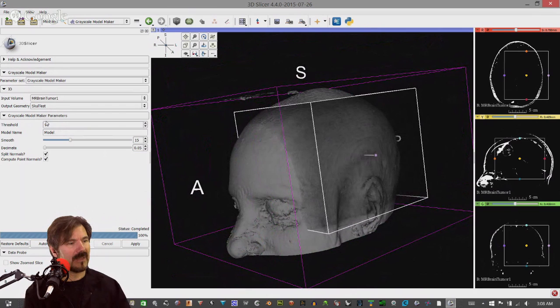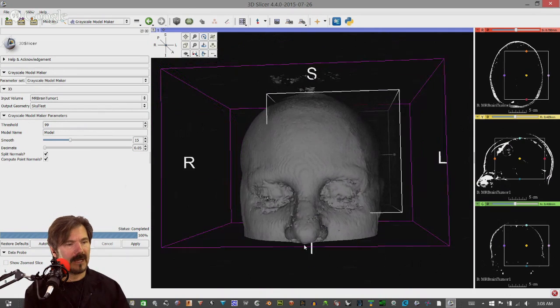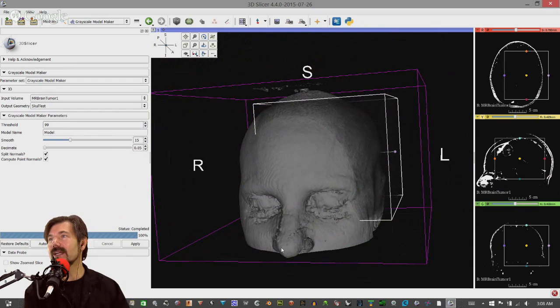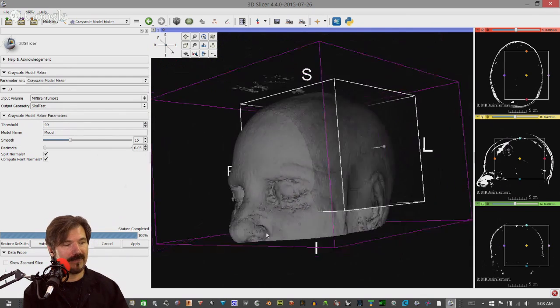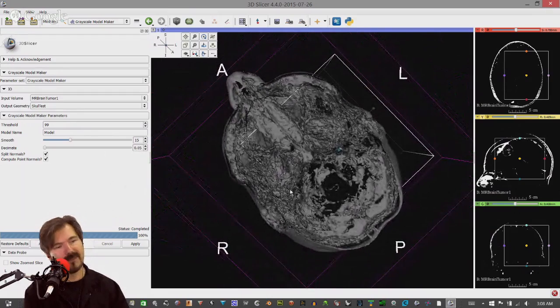So yes, I put it at 99. Like I said, 100 didn't seem to do anything. 1%, as you saw, actually worked on the inverse side and gave me a volume of empty space, which showed it as a positive space. So there you're seeing a surface. So this would be a quick way if you wanted to CT scan yourself and create your own model of your head. But notice when I open it, there's a lot of stuff inside here.